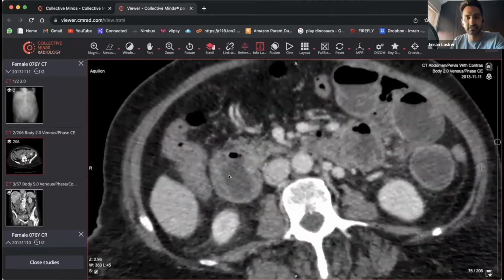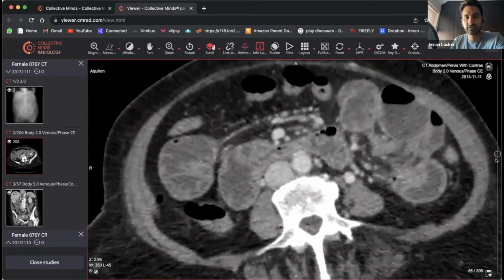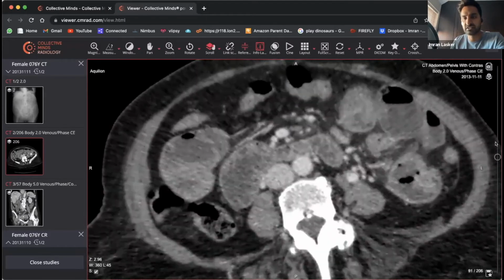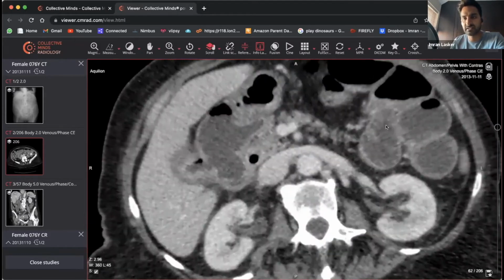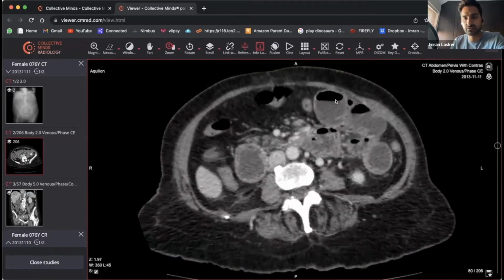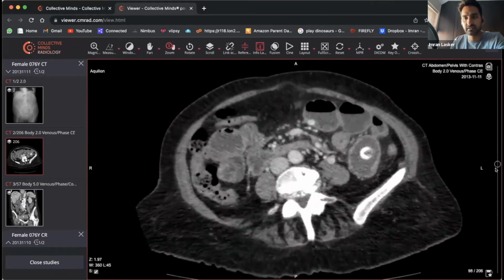As you go further down along the first part of the duodenum, it looks a little bit dilated. Beyond this area, it's usually collapsed. Most of the time it's very, very collapsed around this region, and if there is dilatation, it dilates later. Again, it does feel like it's dilating a little bit later. Let's zoom out a bit, and as you scroll through, this is all quite dilated, and we just have to follow it.